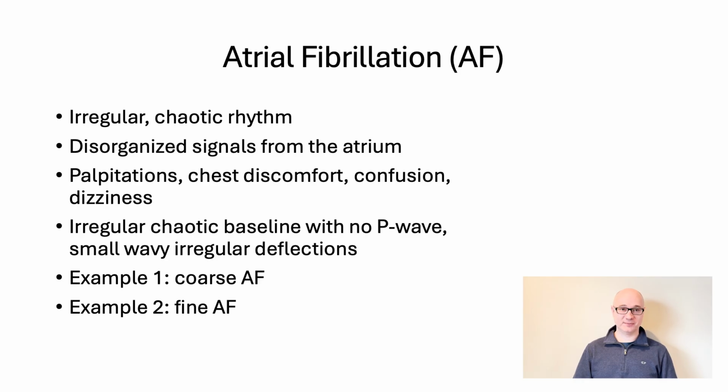Patients with AFib typically have chest pain, palpitations, and dyspnea. And what you can see on the EKG is, first of all, a loss of a P wave, a loss of atrial regularity, and then you see a fine baseline of irregular atrial activity. And then you usually see what's called irregularly irregular QRSs.